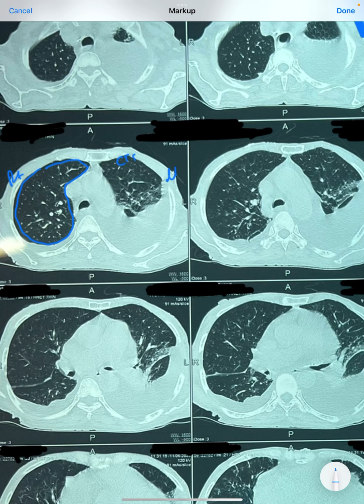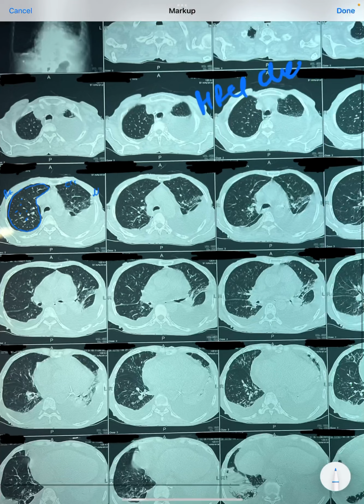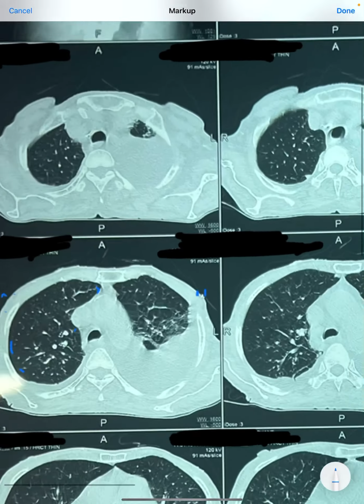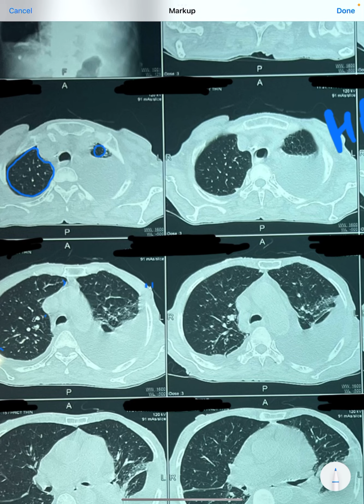HRCT, that is the CT scan, is basically an X-ray, and on X-ray we see air as a black structure. So this all black is all air which is there inside the lungs. Now whenever we see, the bilateral lung field should be almost equal, but what we are seeing here, just see here, on the right side the lung is pretty clear, pretty okay, but on the left side we are able to see a very small portion of lung, and this is all hyperdense or whitish structure.